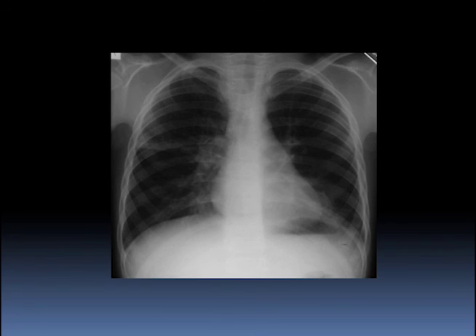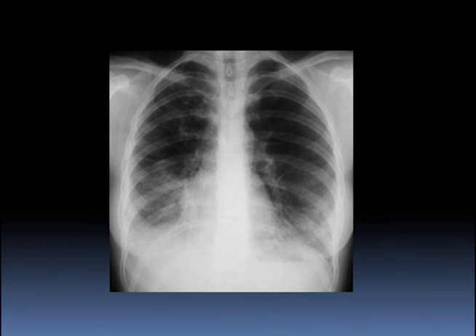Again, if we look centrally on the left side, you should be able to see a bronchus coming right out at you. And that's another characteristic, peribronchial cuffing, very common in this disease. Now, when you see children coming into emergency with pneumonia, they commonly have a bronchopneumonia. They rarely get lobar pneumonia. Here's another example of an adult with a bronchopneumonia.